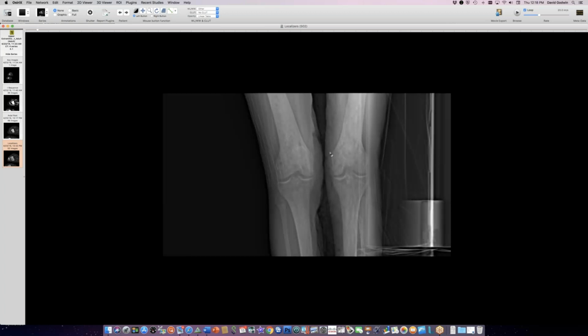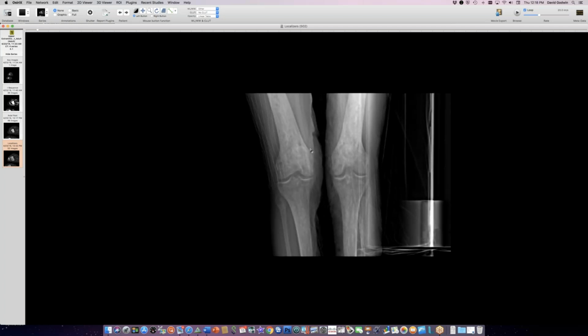I think that this pseudo plain film finding here, combined with that aortic disease, points strongly toward Erdheim-Chester. Now we don't have a biopsy to prove that, but I think that's a very reasonable presumption given this pattern of long bone sclerosis. This is pretty distinctive. And I think Erdheim-Chester is about the only thing that does this. Without the bones, I would have just said Takayasu most likely, but certainly that doesn't affect the bones really like that.